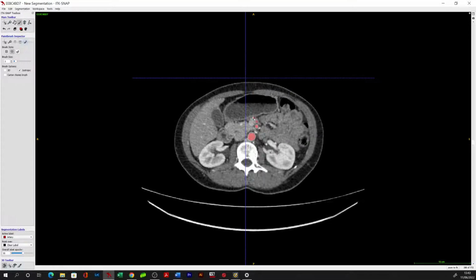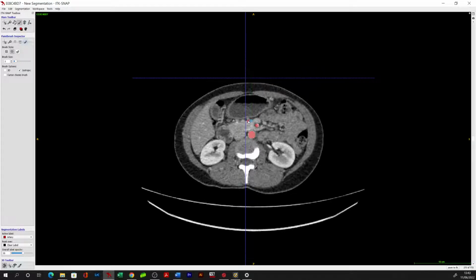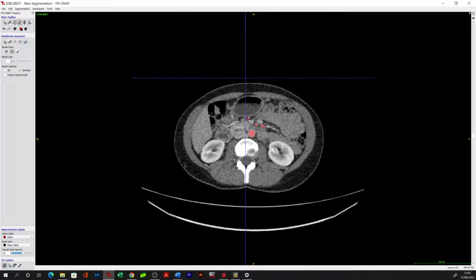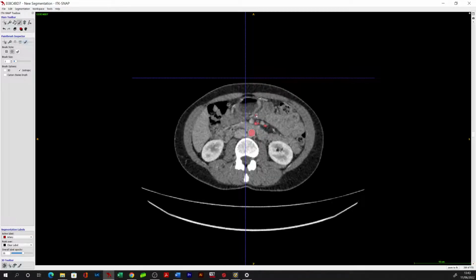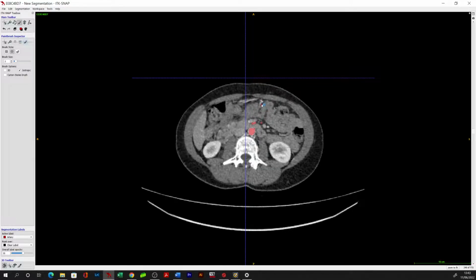And we'll just follow this middle colic artery as far as we can take it. It's certainly useful in these sorts of scans to segment the arteries as far as you can, because then you've almost eliminated one of the potential confounders that you may misidentify as it passes along its course. Even on an arterial scan, you'll notice that as we move more peripherally, the degree of contrast starts to fade. So it is useful in these situations.